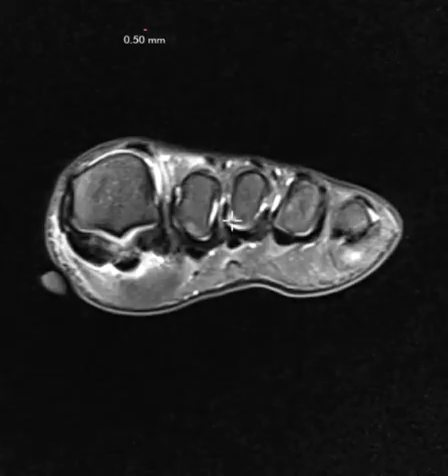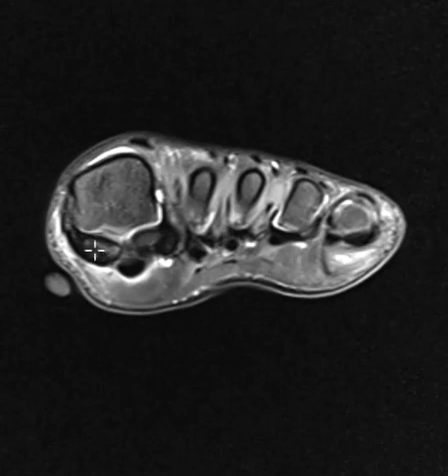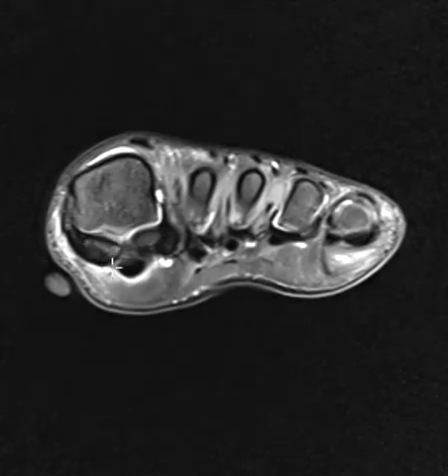So if we go to the PD fat set sequence here, we don't see really prominent hyperintense signals. Pretty intermediate signal, a little glaze of brightness, and here's some dark area down here, so probably reactive sclerosis and some minimal edema. And so this is related to injury where they have trabecular microfracture and some mild reactive marrow edema, but there's no collapse of the sesamoid bone. You could just call this a stress injury, a stress fracture, but no evidence of a collapse.